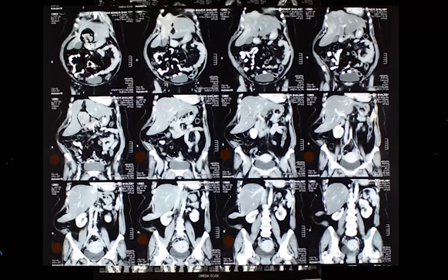Let's go. What's happening with this woman or this man? The scale. Where's the scale? Where are the coronal sections? Where's the scale? Show us the scale. Where's the scale? Carlos was asking about the scale.